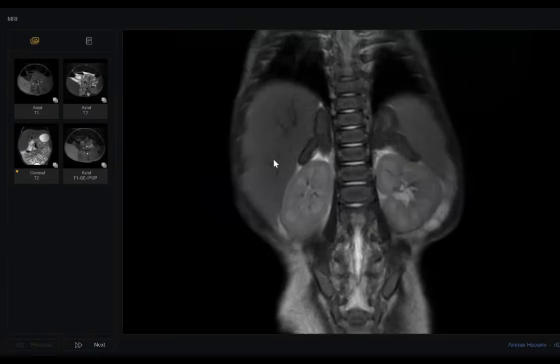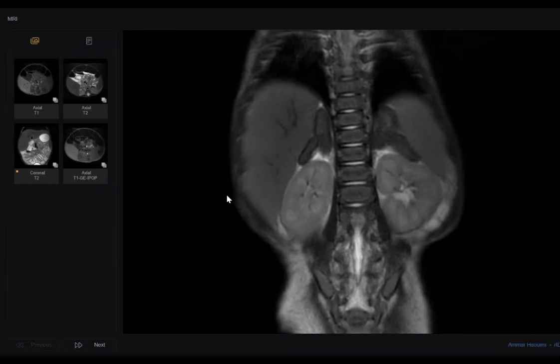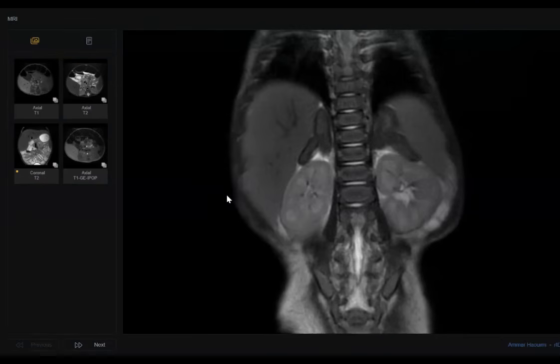See, doctor, hepatomegaly is there, from the CT, the mild shaggy liver. Your main concern was in this region. Okay, did the MRI confirm your diagnosis or not? This is the first question you should ask yourself. Did the MRI confirm your diagnosis or not?